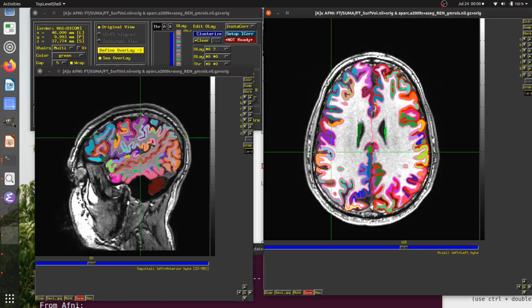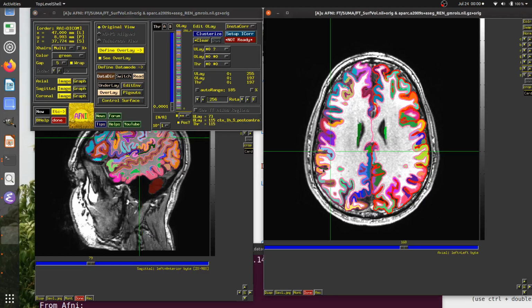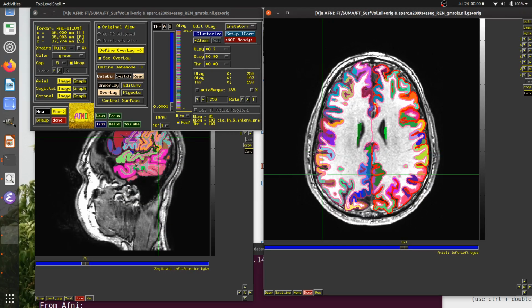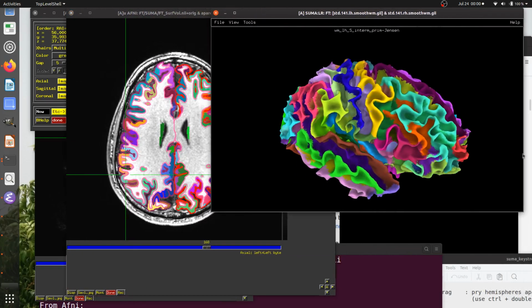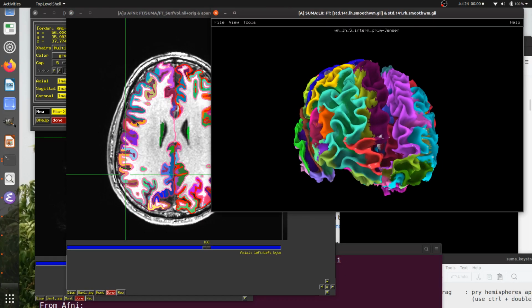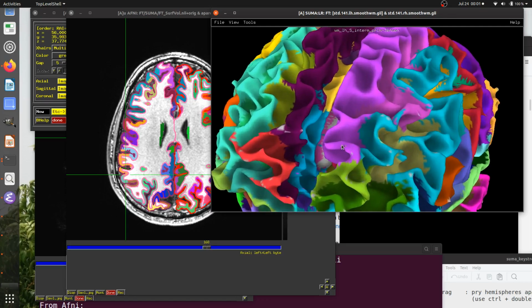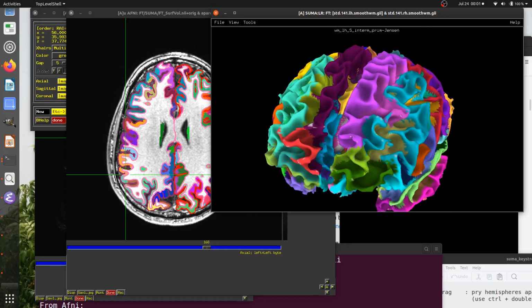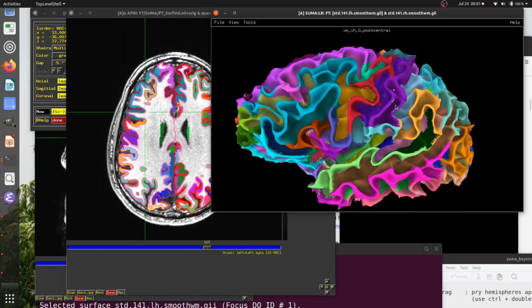Okay. So now here, if you notice here, the same labels that we expect in AFNI are there, so fine. The labels from FreeSurfer are still around. What's happened in SUMA? Well, all the colors from my overlay are being sent to SUMA. So it's not sending numbers, it's really sending the colors of where the surface is intersecting the overlay data set. So sometimes little bitty pieces will be left off from this because I only have something that's right on the surface.